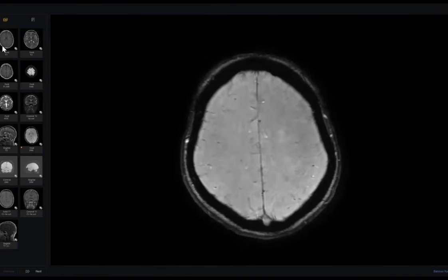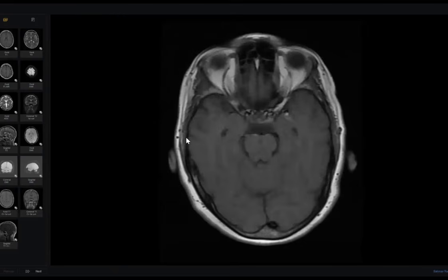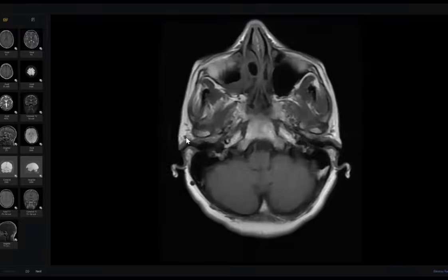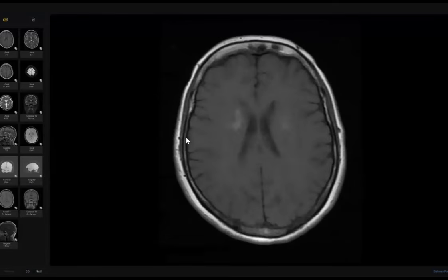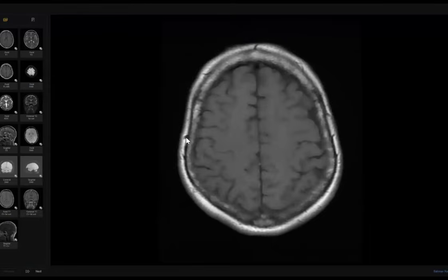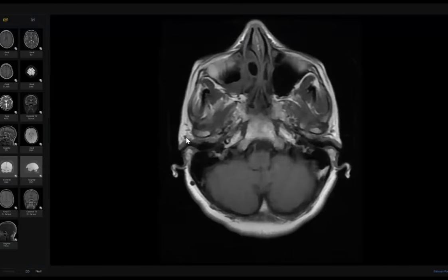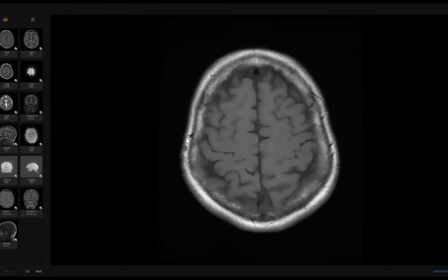But doctor, are you sure this is calcification? This is bright in T1. Are you so sure? This is depositional, likely depositional. What do you mean by depositional? Likely mineral deposition, because it's high paramagnetic, high in T1 and low in T2.